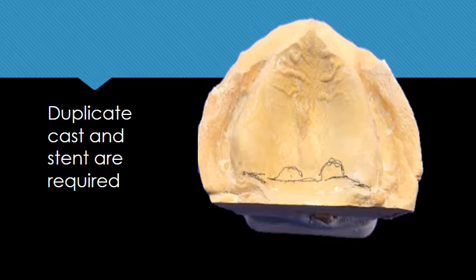The preparation of the post-palatal portion of the cast is shown here as outlined in pencil. Again, we start at the hamular notch on one side, proceeding through the fovea palatina and ending on the hamular notch on the opposite side. We then scrape the stone from the depth of the posterior border to a fine bevel towards the anterior portion, creating a depression in the stone. This will assure and increase the retention of the record base as well as the denture itself.